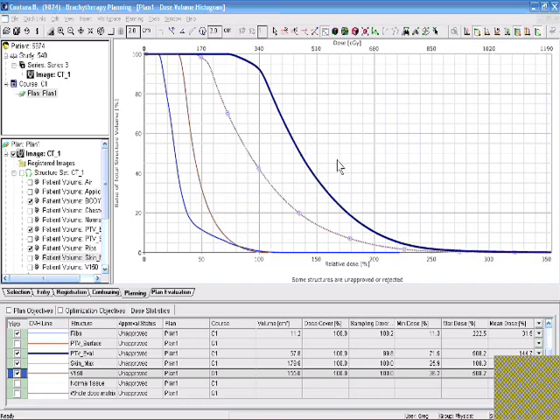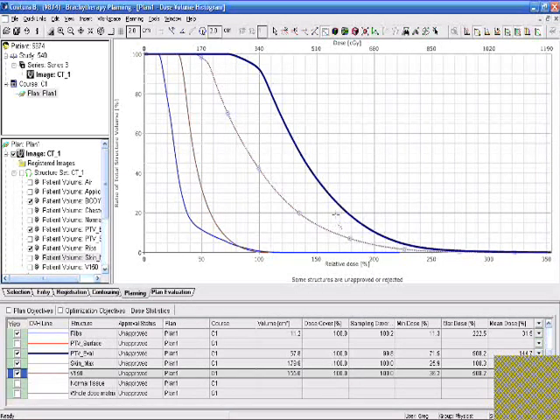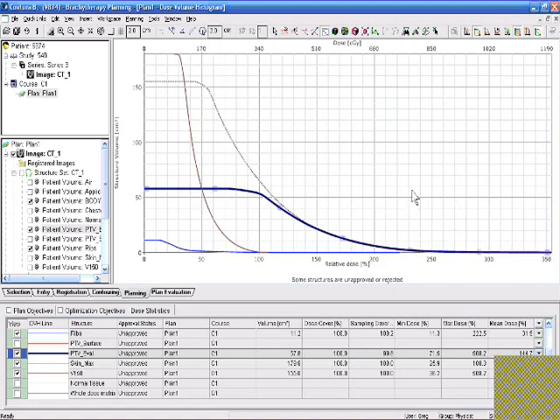So we need to look at our DVH in some detail and see what we have going on. I've set this relative dose and relative volume. That's what we need to do to show our coverage. And so we're going to look at something like V95 here. So I'll set this as close as I can get it to 95. And we have very close to 95% there. So I would call that a good day. We're okay there. Now we'll switch over to absolute volume for the other parameters.